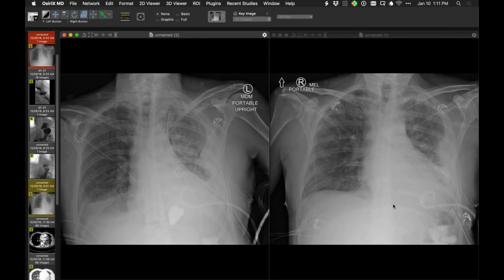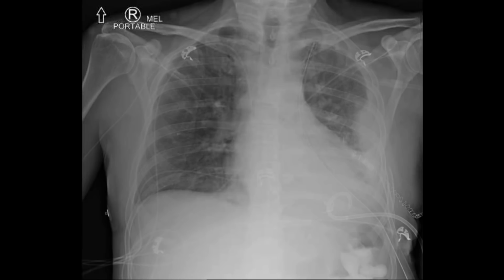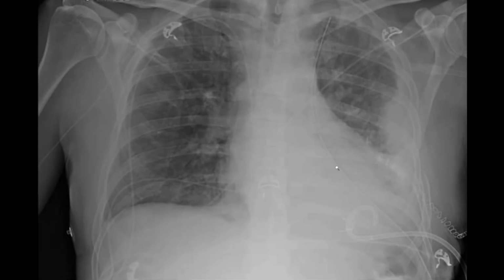The context is that this patient has a lot of problems, but a primary problem is esophageal achalasia. She has pleural space disease. You can see by virtue of this that she received contrast medium evaluation to evaluate the achalasia, and she's had drainage of pleural fluid. But what caught my eye on this radiograph is a new finding, and the new finding is this new object.